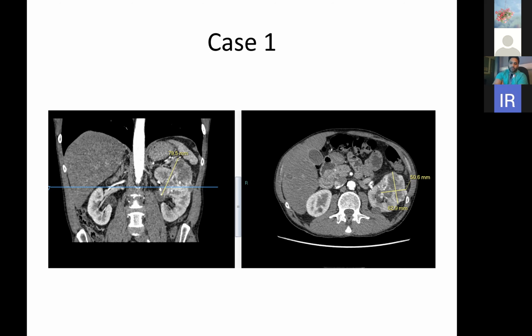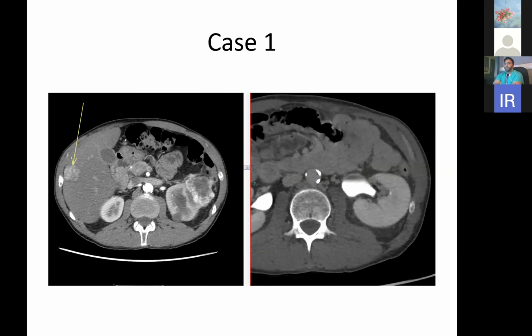Depending upon the lesion and what organ is involved, you'd want to mention things differently. For example, with this liver lesion, I'd want to mention what segment it is, what happens to it on the portal venous phase after the arterial, and what happens to it on the delayed phase. And talk about the contour of the liver. Is there an element of cirrhosis? Could this be a met, or could it actually be a primary synchronous liver lesion? And things like that. So it depends on what lesion you think it is, what you're dealing with, and characterizing things further that way.